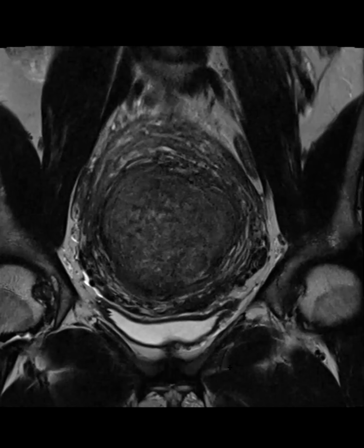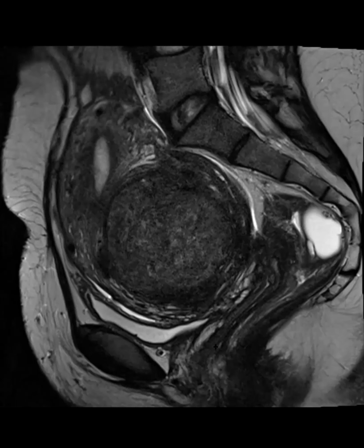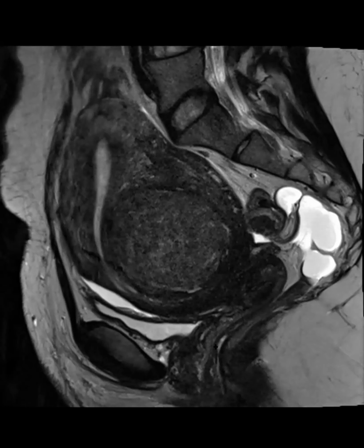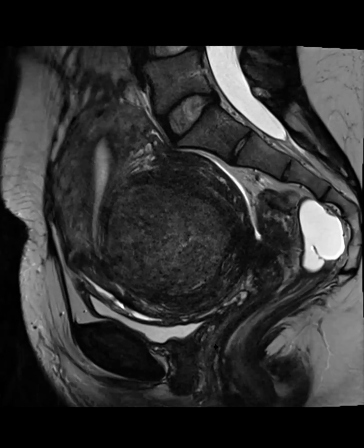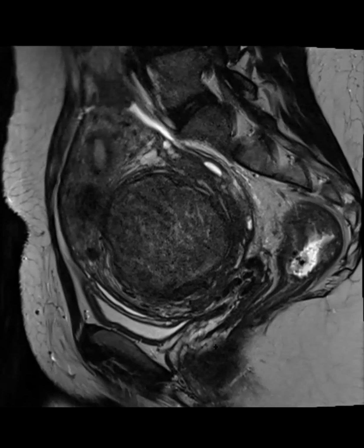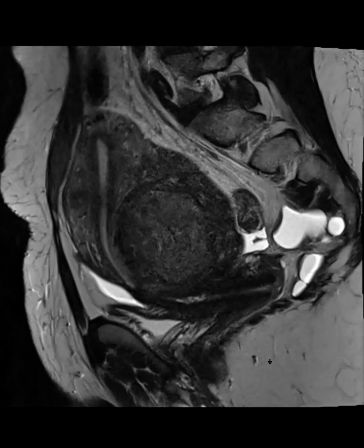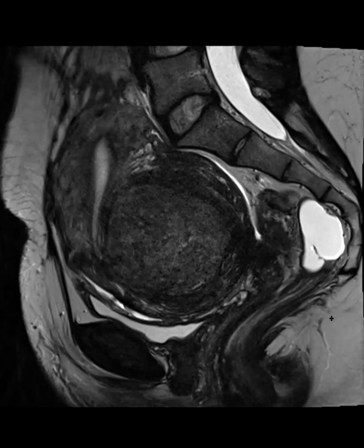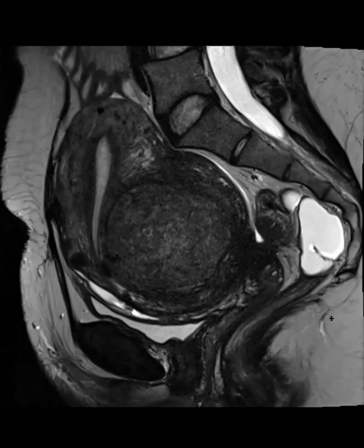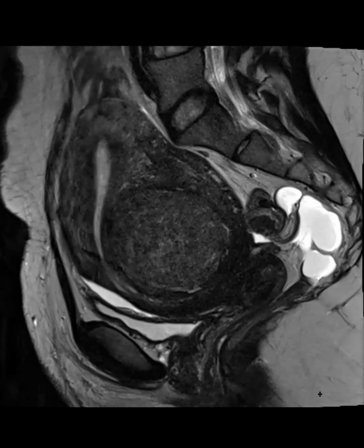I think on the sagittals, maybe. Sagittals, okay. Where? I think it looked like next to the rectum. The tubular structure, the cystic structure. Oh, this thing. Yes, there's a retrorectal cystic thing. Is that what you were trying to show, or was that not it? But that is an important finding. There's another one.